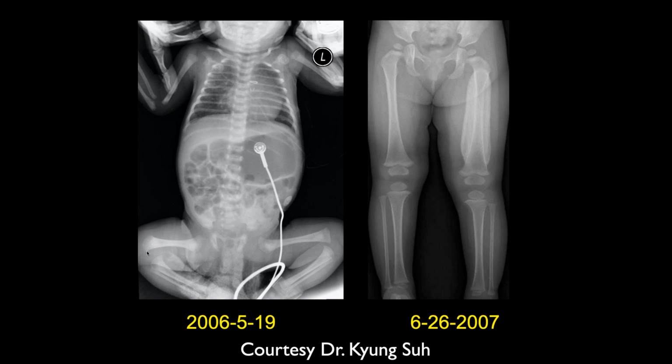Hold on, are those dates flipped? Oh, 2006. Yeah, I was seeing that word. So on the first exam, we see there's marked abnormality of that left femur on the follow-up exam in 2007. And looking at that femur on 2006, I don't think I see an abnormality with it, at least not from here.